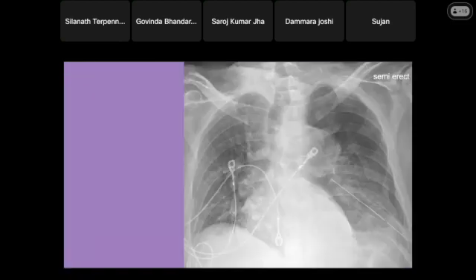Okay, what about this? Now, I'm trying to make it as big as I can to point this out to you. Oh, this is very nice. You see my trachea here, and why is my trachea pushed? It should be right in the middle. This one is not. Why is this pushed to the right? Can anyone tell? It should be right in the middle. Is that a mass here in the mediastinum? The right lung. Sorry, left lung. So it can be a mass in the upper mediastinum or it can be due to an aortic aneurysm. Yes. Okay. Mass in the mediastinum. Good.